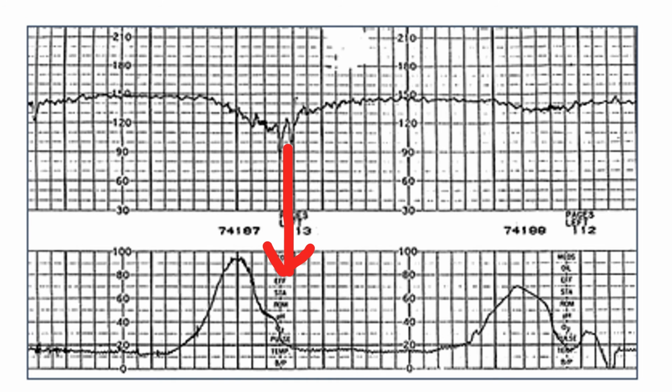In this particular slide, we see a non-reassuring pattern of late decelerations. We are calling this late decelerations because the uterine contraction is starting here, but the deceleration is starting here. So it is starting after the onset of the contraction, and then the bottom point, or the trough, of this deceleration is after the contraction has peaked.